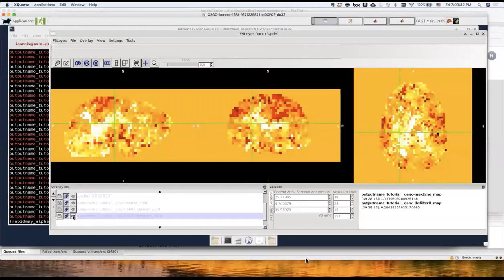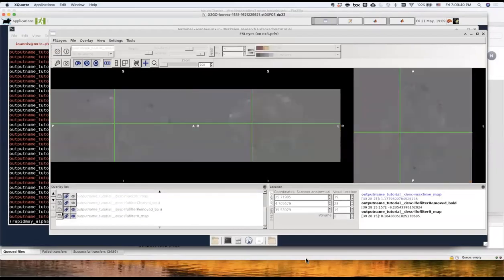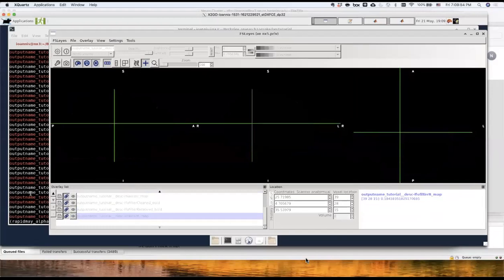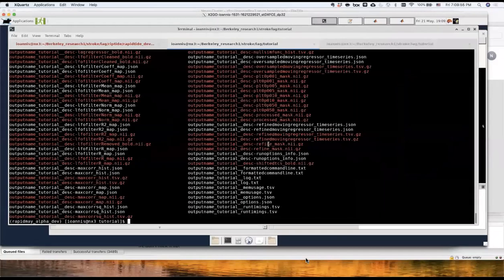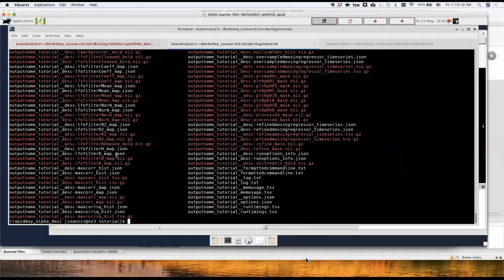If one wants to see how the regressor fits in the GLM around the brain, one can use these GLM statistic maps to get an understanding as to how big the fit is in each part of the brain. Okay, so I've shown you a bunch of maps that are basically NIfTI files that live within that. And those are not the only ones. You can find a lot of different maps that can be of potential interest to you for your specific study.